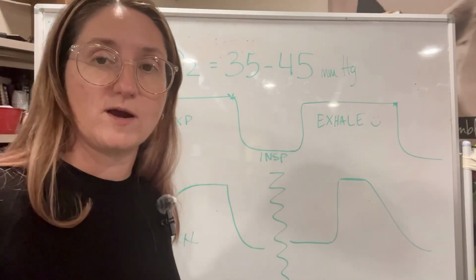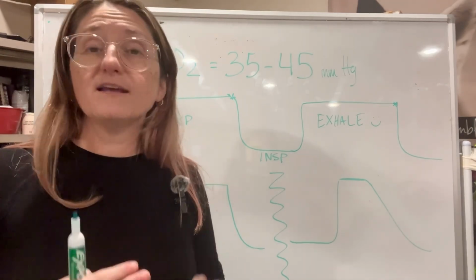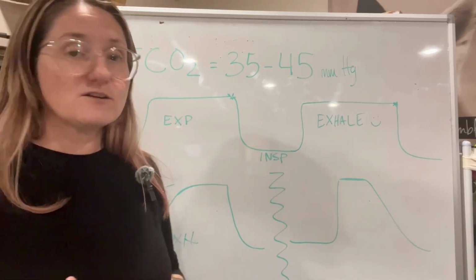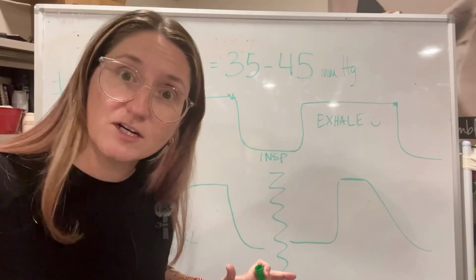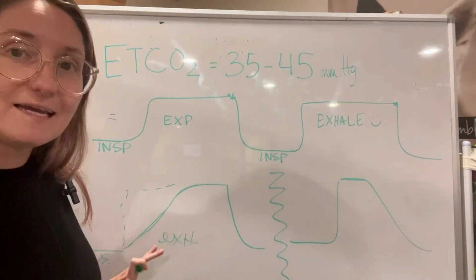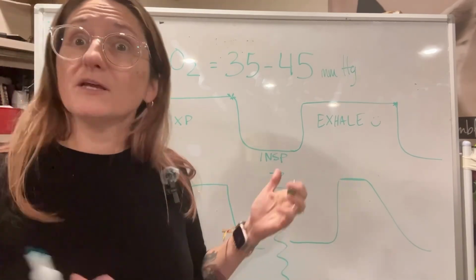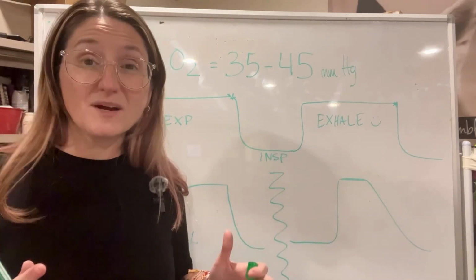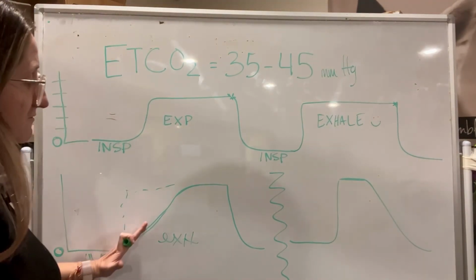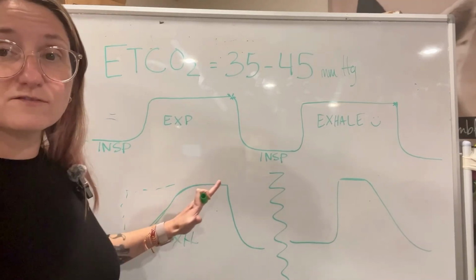So we need to go and figure out where. First thing I want you to do is take a look at your patient. Are they breathing normally? If you have an esophageal stethoscope, take a listen. Do you hear normal chest sounds? Every once in a while, did your surgeon put the drill on the patient's chest? Sometimes they do that. So is there something blocking that airway or blocking that breath? Commonly we see this with mucus plugs in the system. Every once in a while, you can also see it with a bronchospasm that really tightens up. So anything that is preventing that breath from getting out, or blocking that breath from coming up to plateau.